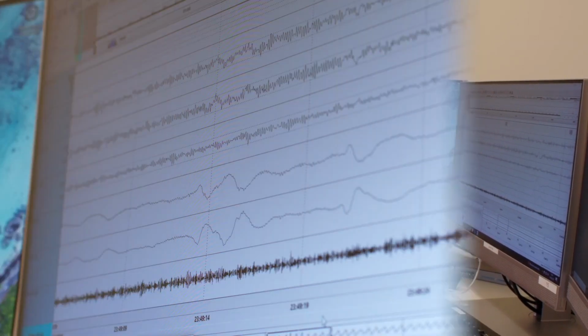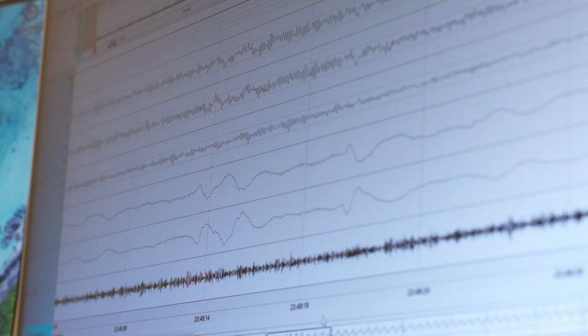Here, for example, we see the awake state. You can see the patient's eye movements. They're looking around the room. The EMG is still relatively high. We'll see in a moment what it looks like when it's very low. So by high, you mean there are still strong muscle movements that you've recorded from the chin, right?